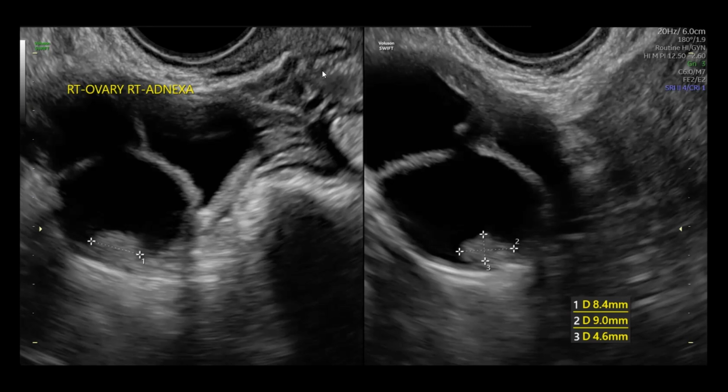And so fast forward a few months, we finally have received the pathology confirmation on this particular ovarian mass, and it is indeed a borderline serous cystadenoma. So we were quite correct in our prediction based on ADNEX, though, of course, the majority of that percentage still statistically suggested this was going to be benign. But there was enough concern here based on the features, based on the score, that this should be removed, and rightfully so. It was, in this case, rightfully removed.